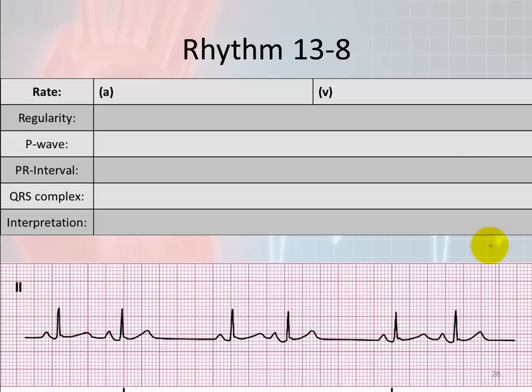Last one here, then we can move on. Atrial rate looks to be here. Ooh, this is interesting. This actually looks like it's going to be harder to determine because we have bigeminal PACs here just by glancing at it. So I'm going to look here, and 300, 150, 100, so that's about a 90, 80 maybe. And then 300, 150, 100, 75, 60, 50, so there's a 50, so we'll just average it and say about 65, maybe 70. You can do the math and actually calculate it, but I'm trying to hustle along here because I know how this can be drawn out.